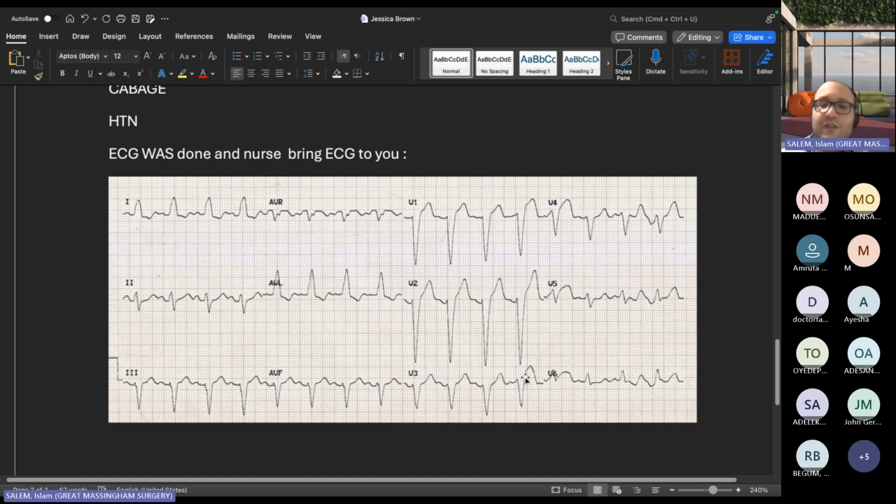One minute, don't run. You said a very good thing: the Sgarbossa criteria. So is it Sgarbossa positive or negative? This is important, because how will you differentiate between a new onset and an old left bundle branch block in the acute setting, or in the GP setting? I met a couple of cases in the last week with the same presentation, no old ECG, and the patient had CABG, and then I need to take a decision: is it a new or old left bundle?